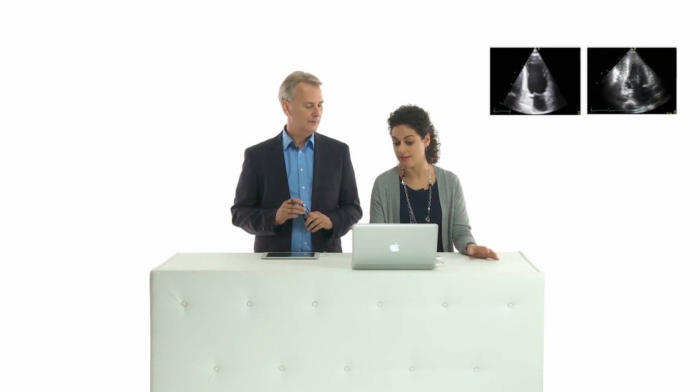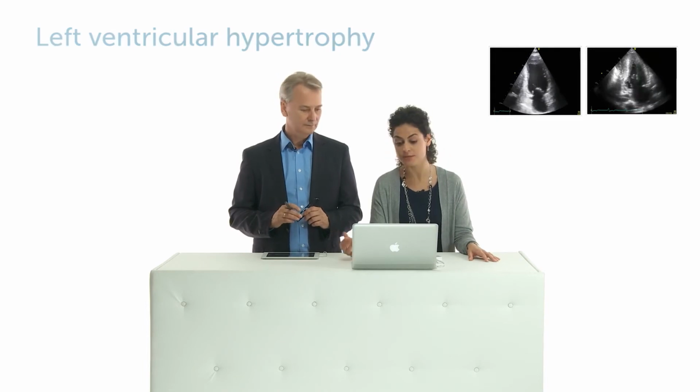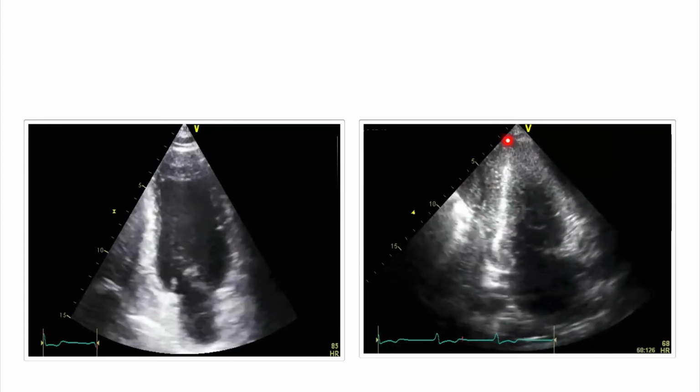And moving to the next case, we have again left ventricular hypertrophy, so we can also see it in the 2-chamber view. Yeah, massive LVH here at the apex. Remember, we can see the apex very nicely in the 2-chamber view. We showed you in the demonstration that you can actually see a thrombus there, for example.